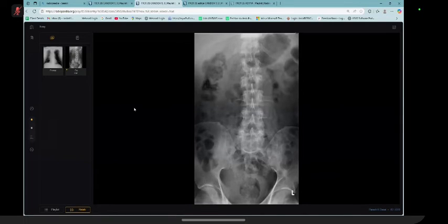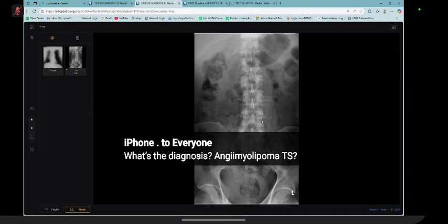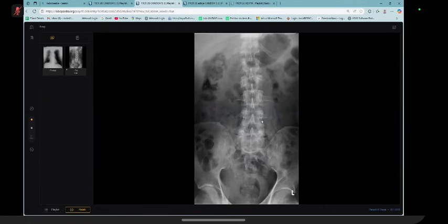So this is a radiograph for you. First, this one. And then I'll go ahead with another radiograph in this patient only. He's having back pain and a bit of difficulty in breathing as well. First, look at this radiograph. Let me know what you think, and then we'll give you the chest X-ray as well.